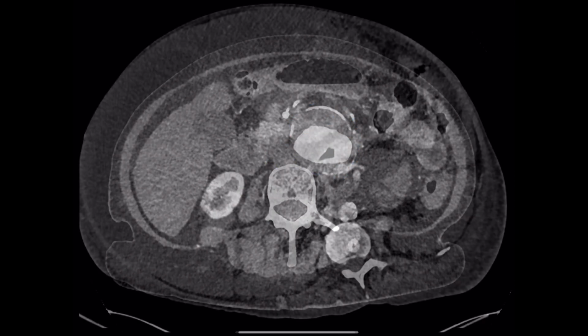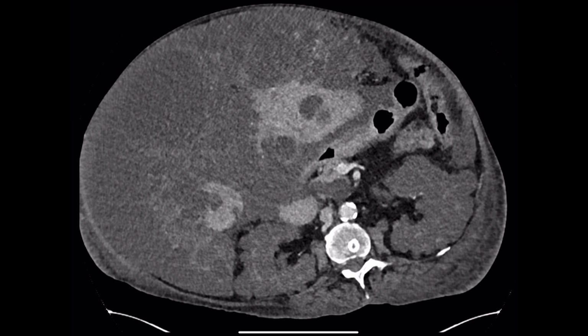Fantastic. Colin, thank you. So, axial view. Even I know this is grossly abnormal. Point me out some stuff. It is so grossly abnormal because the liver's not right, and in fact there are only small amounts of relatively normal liver.